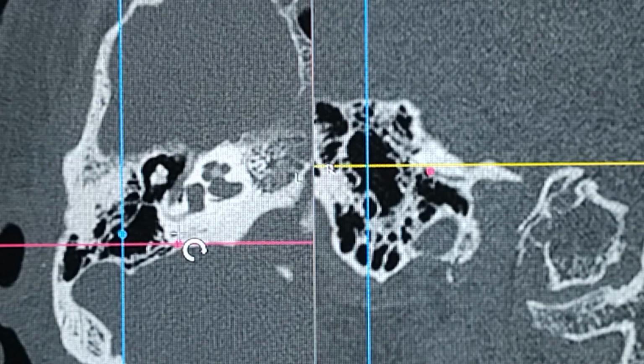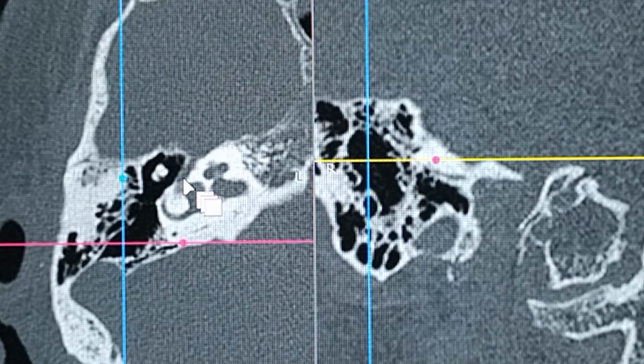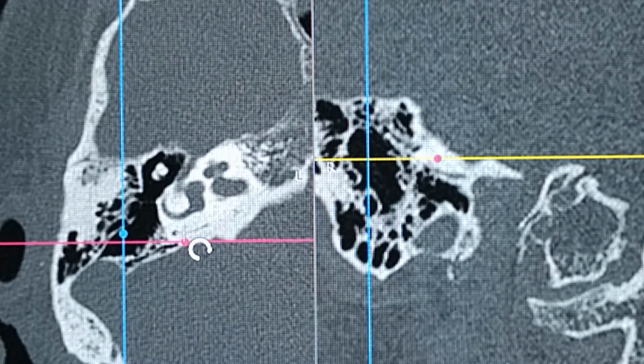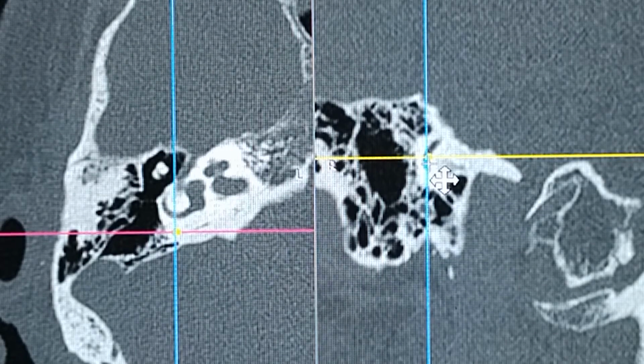Keep on going up. Now you can see the lateral canal, and the facial nerve tympanic segment running under the surface of the lateral canal. This is the cochlea, that's the IC coming into the picture. And this black dot over here is nothing but the posterior semicircular canal. If I keep my navigation on that, you can see on the coronal scan that this is the posterior semicircular canal.